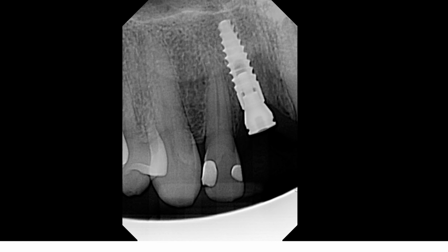Then we can visualize the overall shape and location of the cone, which has drifted more toward the apical region of the tooth. So it's been pushed more superiorly.